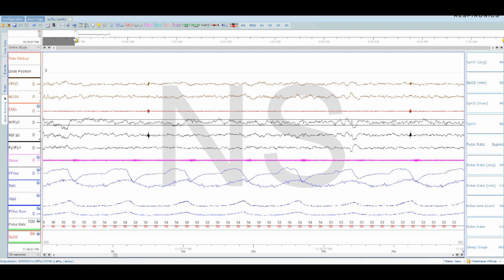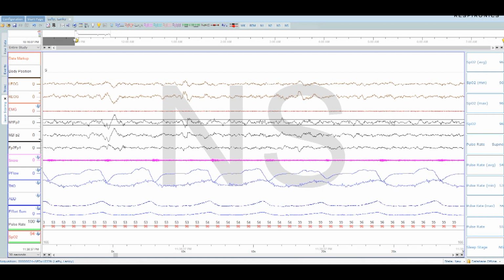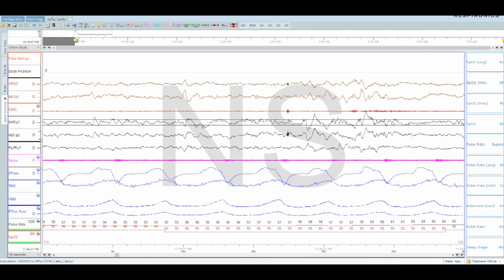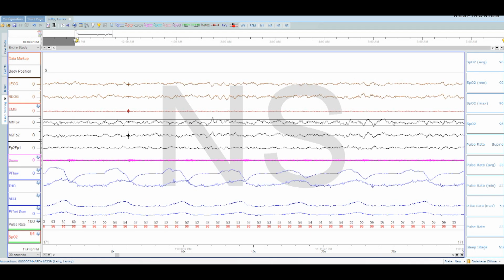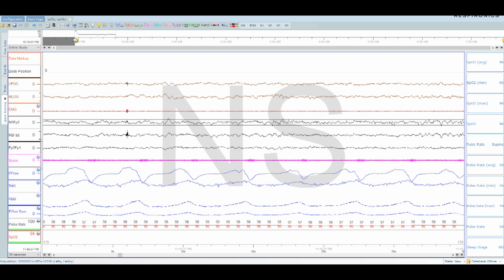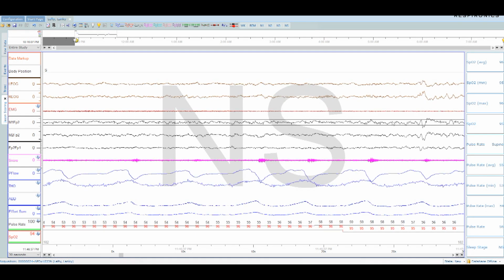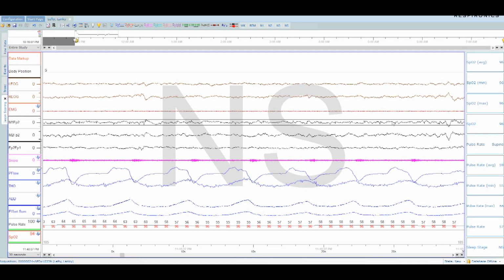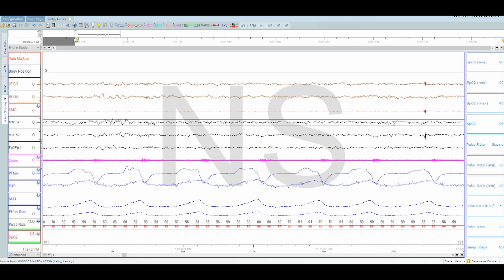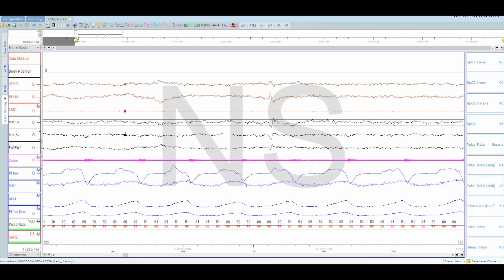So we're expecting, let's see, every 90 minutes, REM sleep. Fell asleep at basically 11, so at 12:30 we're actually not really that close to it. At 12:30, we're going to be expecting our first REM period, unless I have a history of depression, and then you'd expect it after an hour.